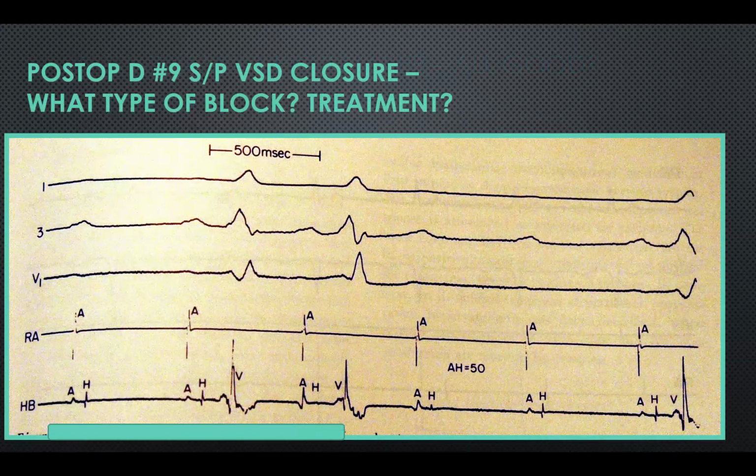So one more here. This is post-op day 9 following a VSD closure. My question to you is, what is the type of block, and what should be the treatment? So why don't we ask Dr. Kalis, the famous presenter at the SCMR, if she's back to give us her opinion on what we're looking at here. I know this is not imaging, but this is our last opportunity to ask you about electrophysiology.